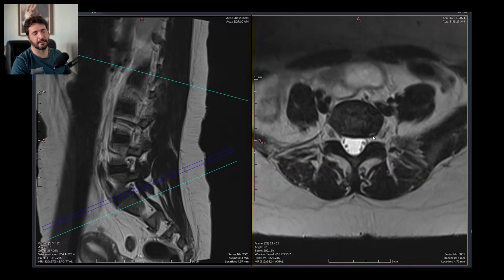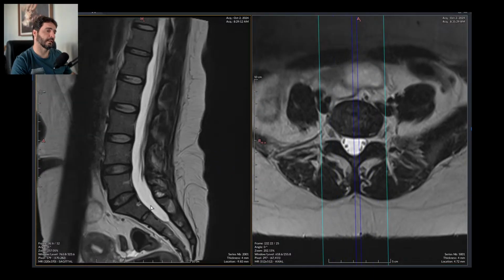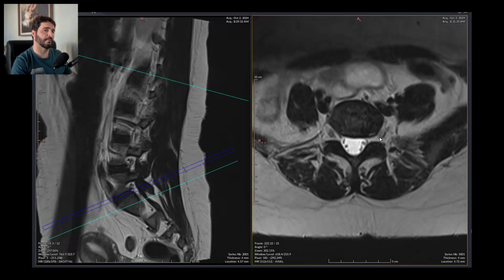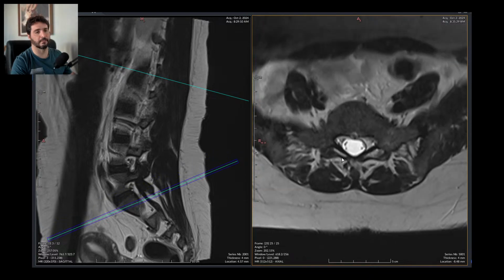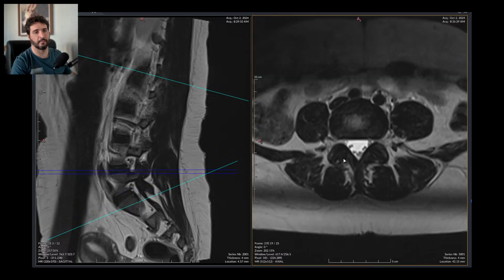This is an annulus fibrosum rupture. The fibrous ring of the disc has a concentric rupture right there. This is painful on itself, but it's quite far from the nerve roots right there, so it shouldn't be a problem, at least not a direct problem.